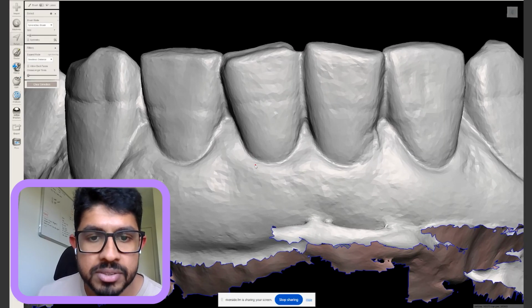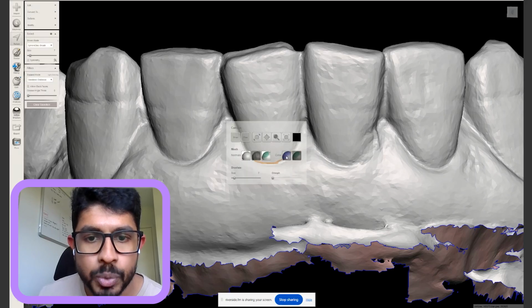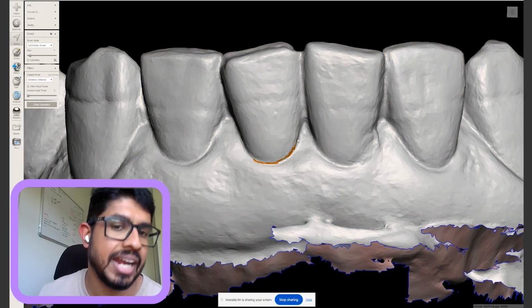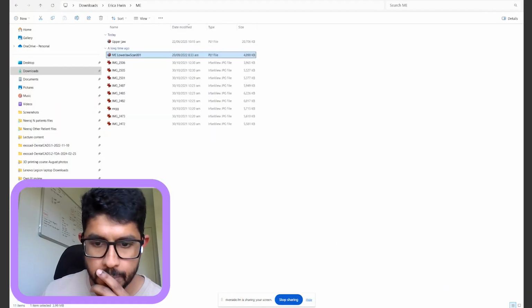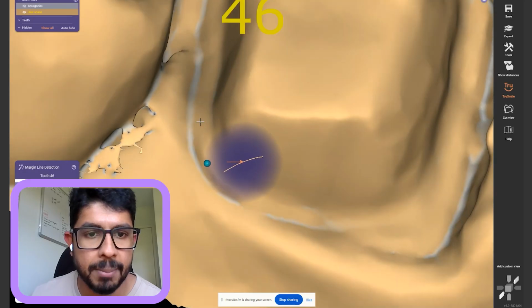So, for example, if I'm marking a margin, I go ahead on exocad, I mark it, and then I can switch the color. Oh, just to be sure, yep, that looks good. Go back to my monochromatic, and I would mark it. But that's just an example of what is capable with a PLY scan, and I just wanted to show that. Yeah, understood. Thanks for clarifying that. No problem. So we'll go ahead and finish our margin.